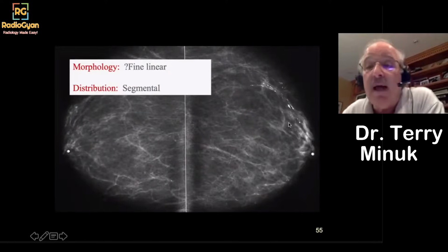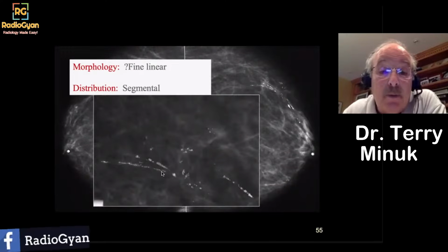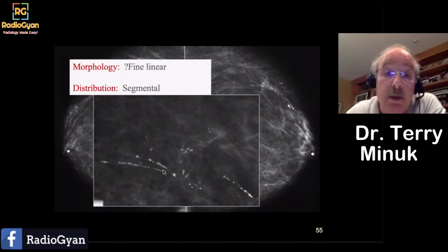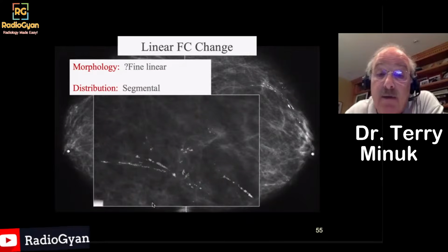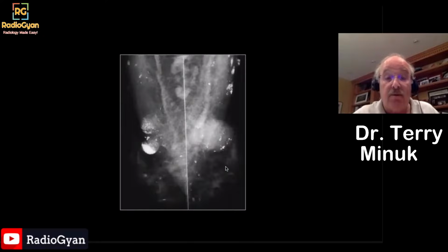And here's one of the last cases. These are linear calcifications. They don't look malignant. They look, but they're clearly in a duct. The duct is branching. There are multiple small fragments within the duct. We did biopsy these, and this proved to be fibrocystic change. There you are, it happens. It's pretty uncommon. I've been doing this for a long time. I biopsied one case like this. Most of the linear branching calcifications you see that you're biopsying are high-grade DCIS.